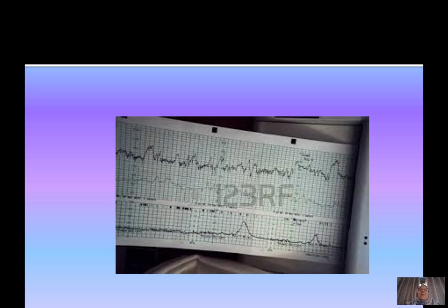Okay, so this is a CTG trace as it comes out of the machine. You can start with looking at the contractions. You see 2 contractions on this CTG. In the first 10 minutes, there's none. Then there's 1 and 1, or maybe these are tightenings. So only 1 in 10 minutes. This patient is not yet in labor. There are no regular contractions yet.